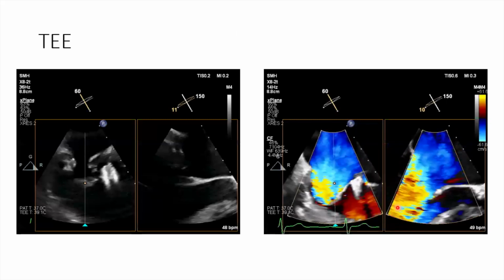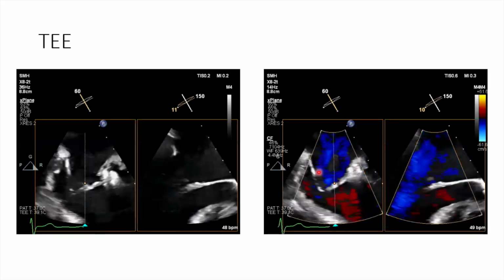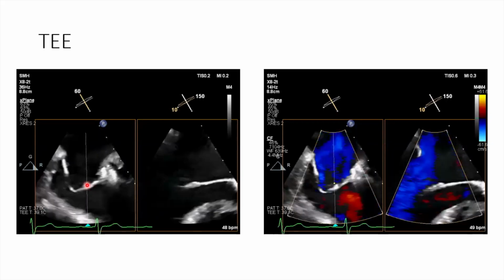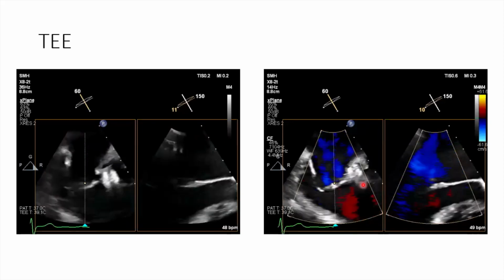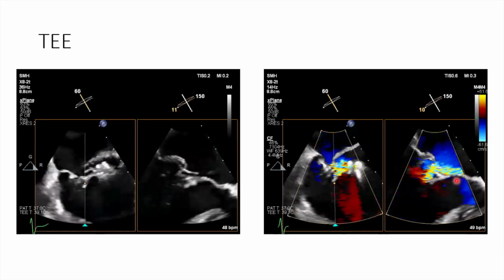So this patient ended up going back to get a transesophageal echo. And again, I'm showing some X-plane imaging across the commissural views. What we see here is in this medial A2P2 segment, you see this posterior prolapse with flail. And this is actually the source of predominantly where that regurgitant mitral jet was.